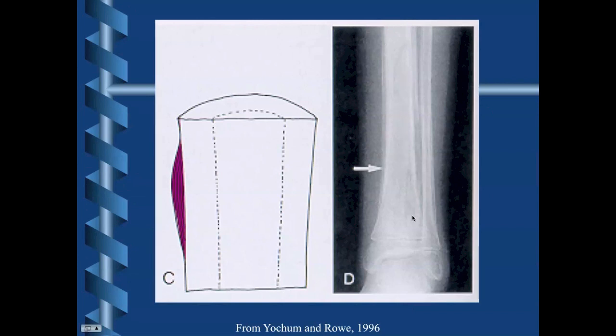It's very hard to pick where this thing starts and where it stops. And then when we look over here, it's a little bit hard to see. This isn't a great X-ray, but it serves the purpose just to show you. There's actually layering within the periosteal response, similar to here. So it looks sort of like a cut onion, and you're getting that layering effect.